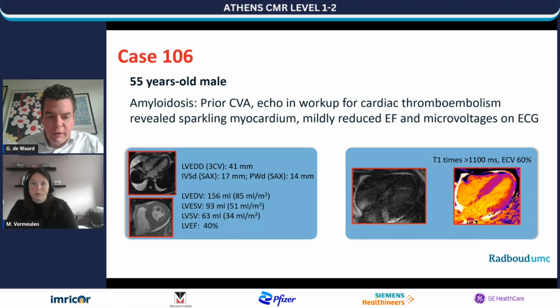Before we enter the quantifications, I briefly want to discuss with you the images that you can see on the right side of your screen. You can see that it's very difficult to null this myocardium in the LGE images, which are very faint. But if you look carefully, you can already see that there's LGE as well. There's pericardial effusion that you can already see, and on the images on the left, you can also already appreciate pleural effusion.